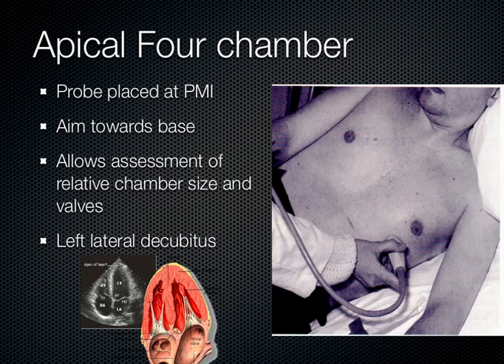Now patients who have chronic obstructive pulmonary disease or who smoke a lot, they lose that PMI, it goes away because their lungs expand to fill that little space. And so this is a very difficult window to obtain in patients who smoke or have chronic obstructive pulmonary disease, or COPD. But this next week with your models, you'll see none of them do that, so they all have really good PMIs, and so this is a pretty easy window to get, hopefully next week.